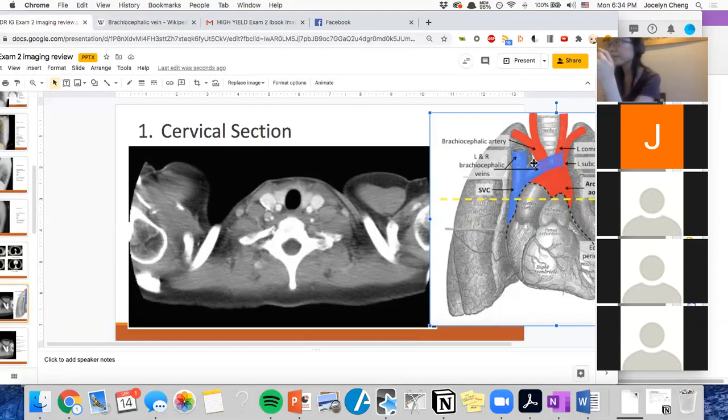So what are we expected to see at the neck level? We're not really expecting to see any of the subclavian veins because they've gone over to the side, but we are expecting to see possibly the vertebral vein, the internal jugular and the external jugular. So this right here is going to be your internal jugular vein. Your external one is going to be out here, right? And then your vertebral vein and artery are probably one of these guys. You're not responsible for these on your exam. If I don't highlight them in the next slide, then you're not responsible for it.